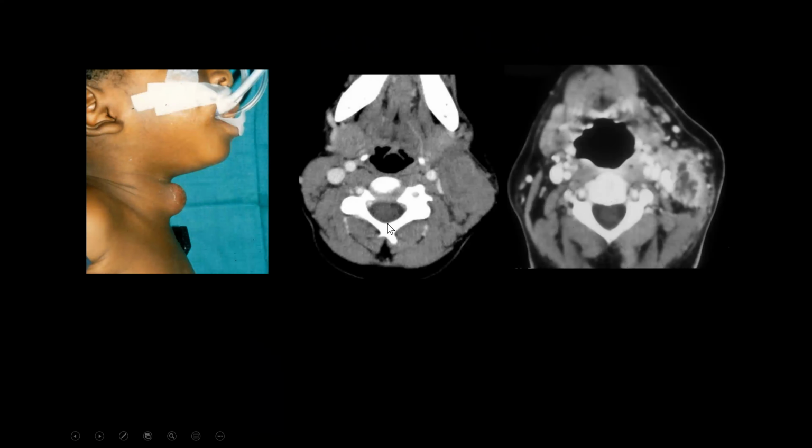Now, this is another example on the central area here. This would be properly described as cervical adenitis. And on the right-hand side, this was a patient that I saw many years ago when I was at the University of North Carolina, probably about 25 years ago. I saw this patient in head and neck tumor conference, and I very elegantly described this as a metastatic level 2 lymph node. Now, they biopsied this, and there was no tumor found. And I was a little bit perplexed.